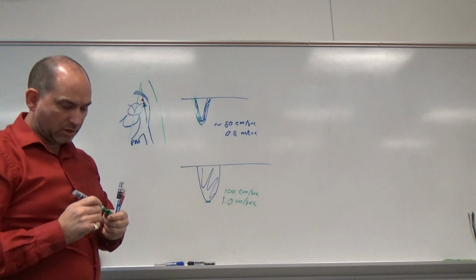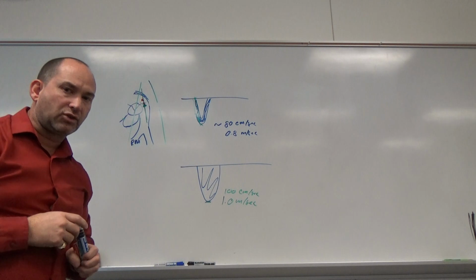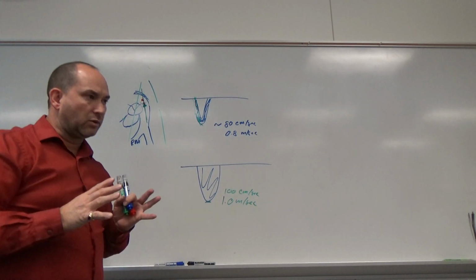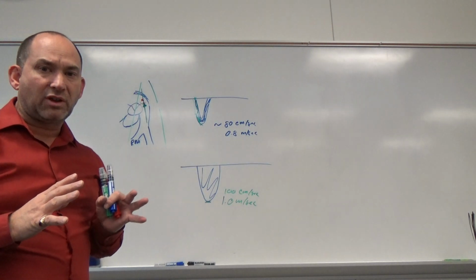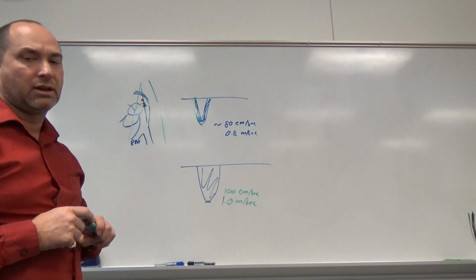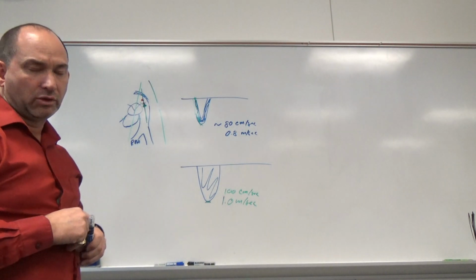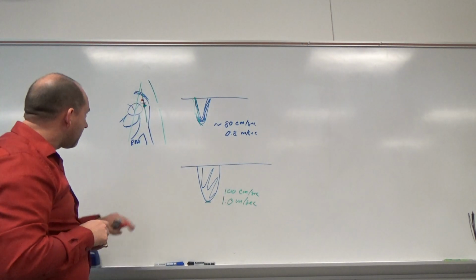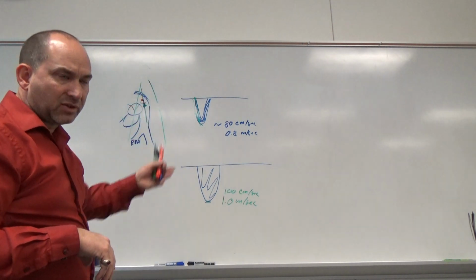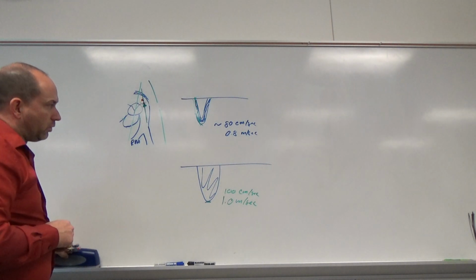So what we're interested in is the time. It's the acceleration time. So the time factor is really what we're interested in on that. The reason being is when it becomes pulmonary hypertension, that becomes steeper, and we get what's called a flying W shape, although that's a term that's really used for M mode. But it will still look like a W, and it'll have a sharp acceleration time if it's hypertension. So that is our pulmonary.